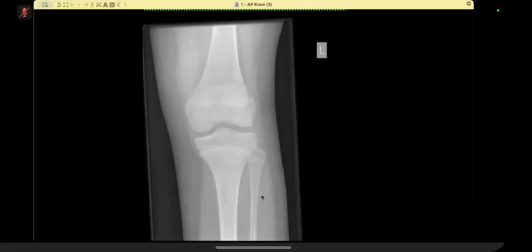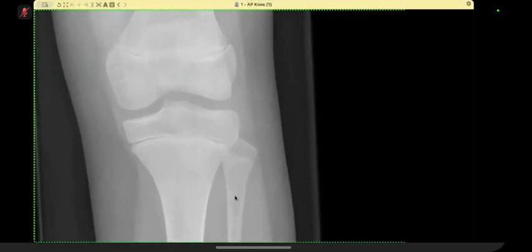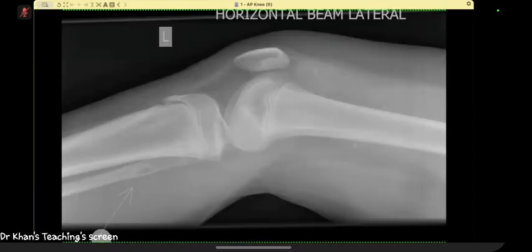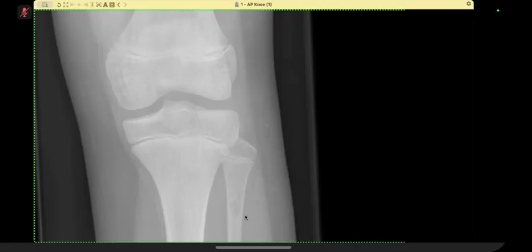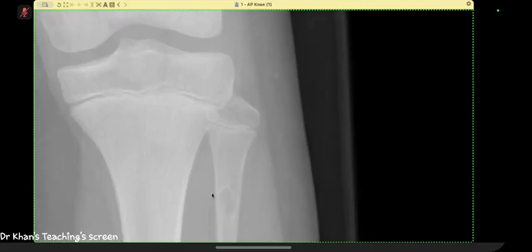Now, in this case, this was nothing. So candidate, you are candidate 4, isn't it? Yes, sir. So the point is that you just went on and on about this. I was not at all interested. It was the wide zone of transition, because on the lateral the radiographers have marked it, so you got sidetracked. Now, this is not at all a wide zone of transition. This is a don't touch me lesion, as in a fibrous cortical defect. It is of no significance.